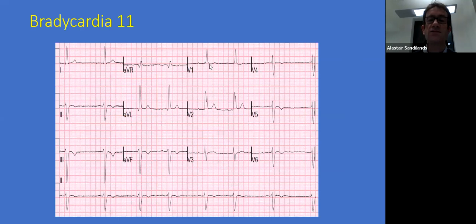End of the S is there, and there's our T. So it's definitely a broad QRS, and you've got this little bump that comes first, and then a big bump afterwards in V1, suggestive of right bundle branch block. In addition, you have left axis deviation, prolonged PR interval, and a sinus node that's got sinus bradycardia, sinoatrial exit block.